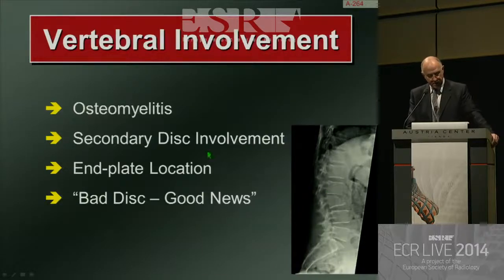So in a nutshell, the disc involvement is almost invariably secondary to the vertebral involvement and the loss of the end plate. But it can be very difficult sometimes. And here's such a case. If you look at this vertebral body, this is a patient who was sent to us from the metabolic unit, a known patient with metabolic bone disease who has exacerbation of pain. And the clinician saw the film first and said, right, this patient now has a complication, which is a fracture from metabolic bone disease. But the problem is, it is not just a benign fracture. Why? Because the intervertebral disc is completely destroyed.